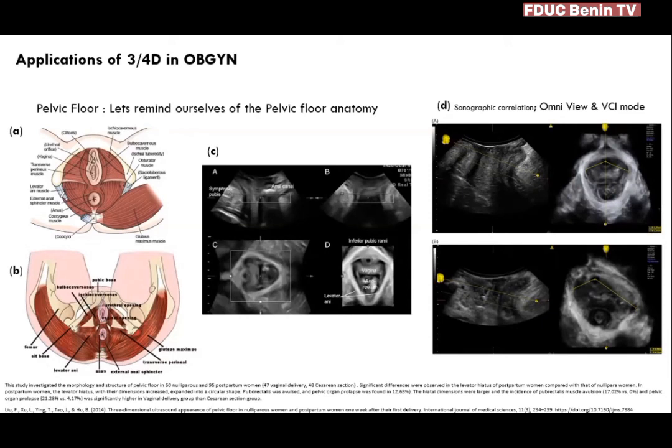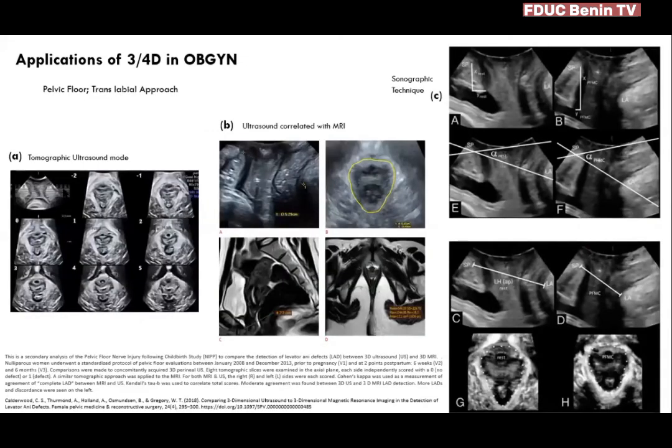And even if there's a clinical suspicion for prolapse, organ prolapse, we're beginning to see that 3D is making a huge impact in clinicians' understanding of the pelvic floor anatomy. Still on the pelvic floor anatomy, I want to draw our attention to the tomographic ultrasound mode and its application here.